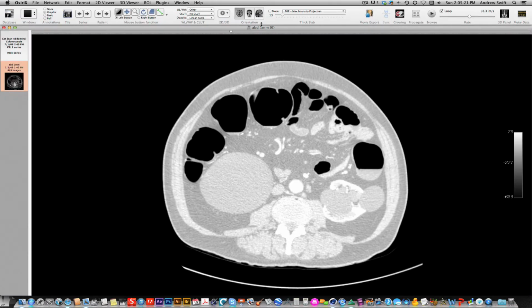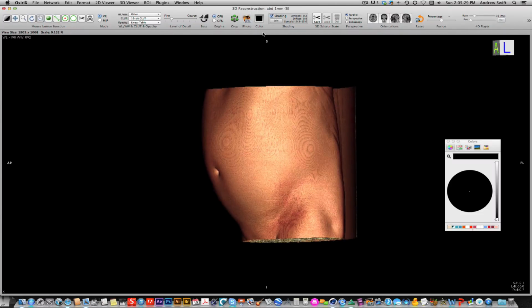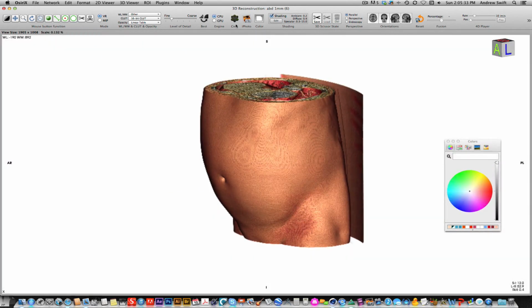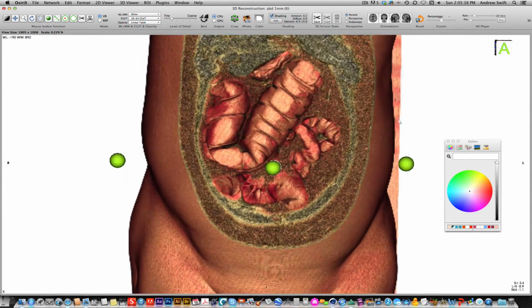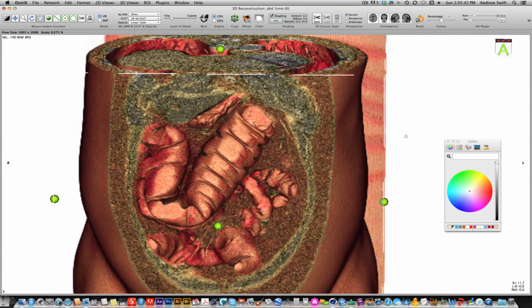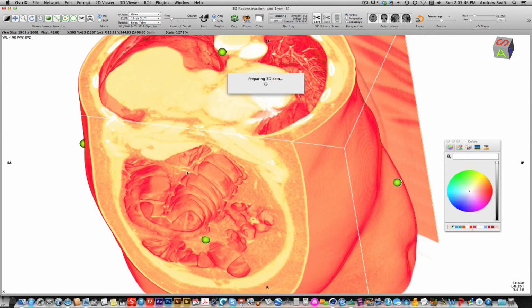and how you do inversion of data sets. And then also, I guess the last thing we could do would be a 3D volume rendering of just the normal data set. And most of the times that these things don't work out, they don't work out because there aren't enough slices in the series, because most of what doctors save on disk and give to you is not all that great. And so here I'm just using the crop tool, and this is just a 3D volume rendering, right? Turn shading off.